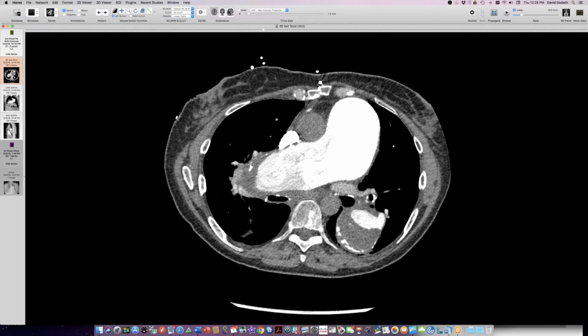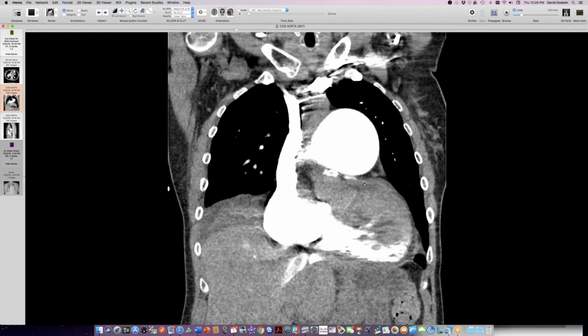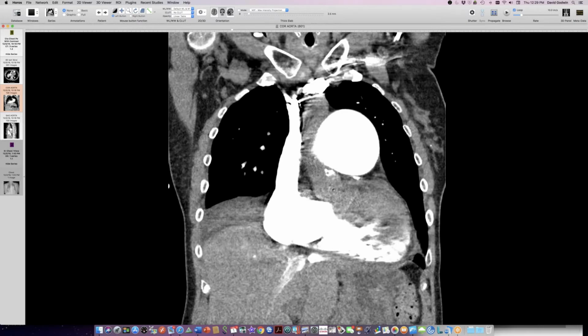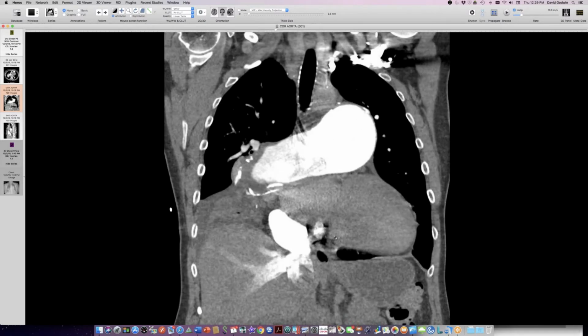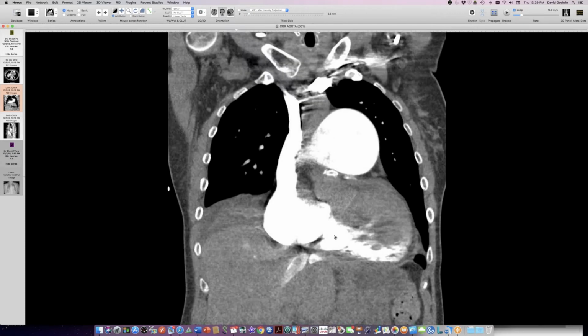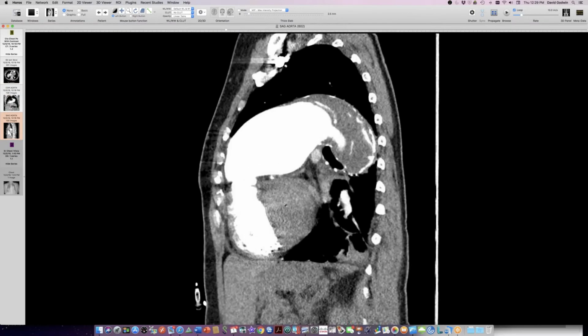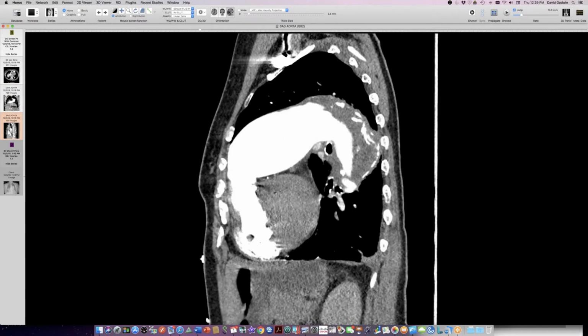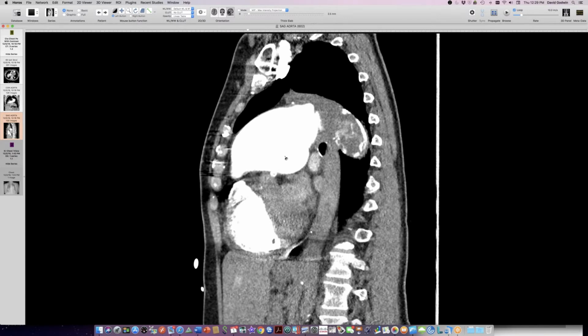And the reason that she has myocardial infarction is that her pulmonary artery is so large that it's squishing the left coronary artery. And so here's the left coronary artery being very compressed by this. So this artery got a stent and you can see the stent in place here because the pulmonary artery was squishing it. So this was ischemic heart disease. She now has an ischemic cardiomyopathy because of this massive pulmonary artery enlargement. We think we can see it on lateral view too, where it is sitting on top of the left coronary artery here. Here's the stent.